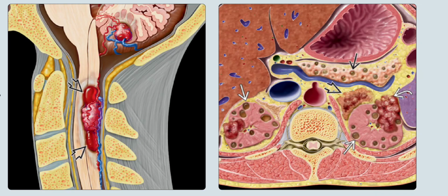So, starting with the imaging descriptions of the von Hippel-Lindau syndrome. So, now we will discuss the von Hippel-Lindau syndrome cases. Left is the sagittal graphic, and it shows 2 hemangioblastomas in von Hippel-Lindau. In this patient, the spinal cord tumor has an associated cyst, and it would cause myelopathy. The small cerebellar hemangioblastoma would be asymptomatic.